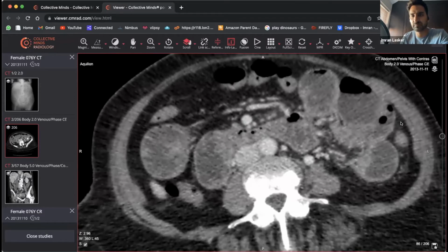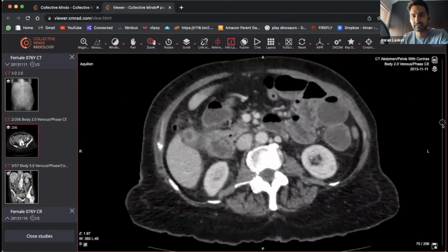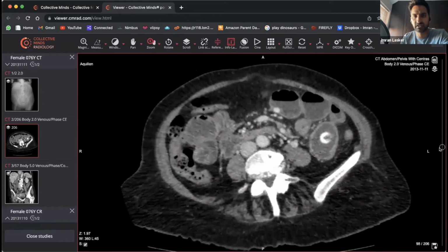Most of the time it's very, very collapsed around this region. And if there is dilatation, it dilates later. And again, you can see that it does feel like it's dilating a little bit later. Let's zoom out a bit. And you can see that as you scroll through, this is all quite dilated. And we've just got to follow it. And then you can see some hyperdense material there. Are we worried? It looks hyperdense, doesn't it?